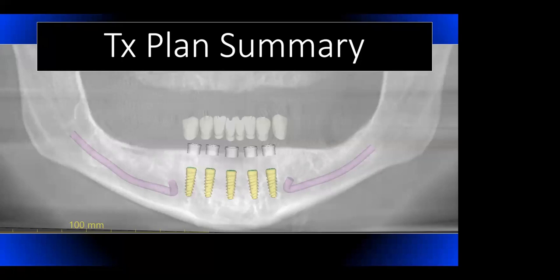Also, in the A and the E position, sometimes because of the angulation of the mandible and the resorption pattern in the mandible, you'll get too close to the lingual plate in that A and E position. So say you're doing a locator attachment right there, you'll be popping through the lingual where you have to bulk up the acrylic, and then your patient will be complaining of speech problems, things like that.